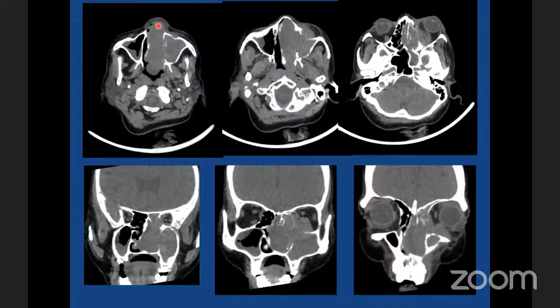Again, if you remember the first case I showed you, the nasopharyngeal angiofibroma, it had a nasal component, but look at this. The sphenopalatine foramen and pterygopalatine fossa are not widened. The lesion looks the same, but the key factor is here. The lesion is extending into the maxillary sinus, and in the JNA, there was not much of that. Of course, you can get it, but it is not very common. So this is anterior antral extension of the lesion. Of course, there is intra-orbital extension also.